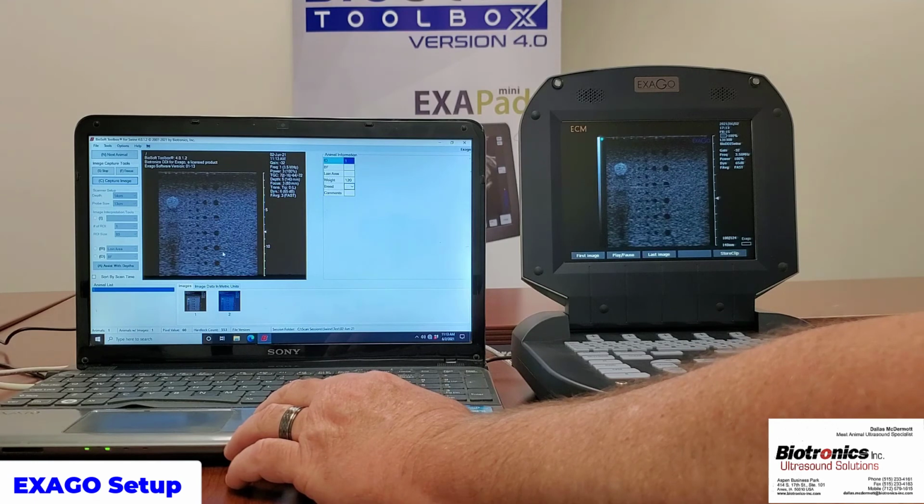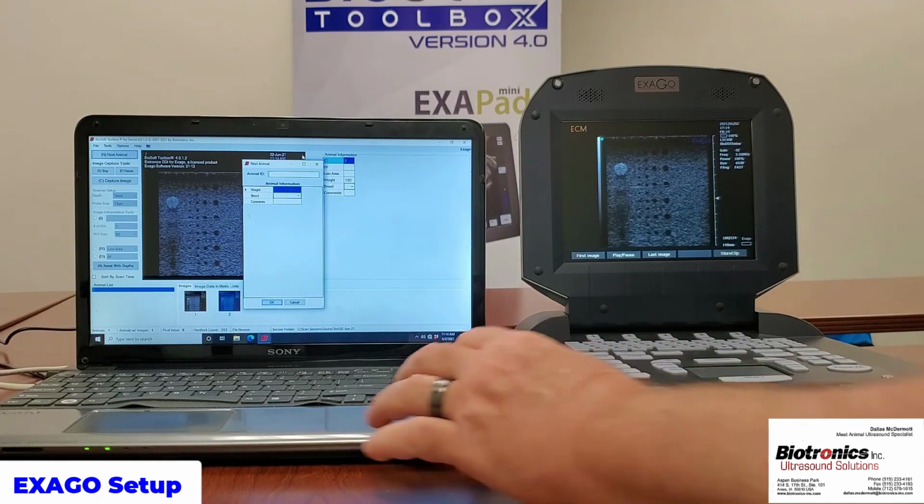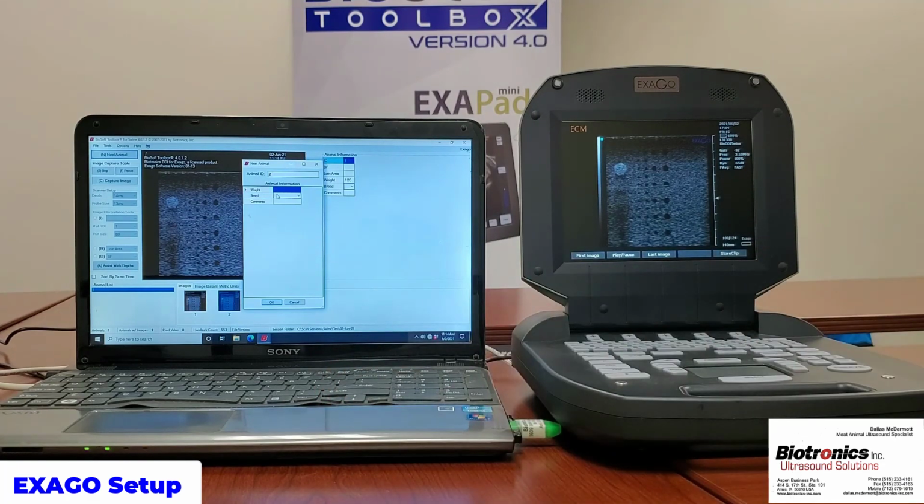If you want to go to the next animal, we can do this and then type in whatever number. We can also populate these fields by using RFID technology and using a wedge program, so that whenever you have the cursor in this field, it will automatically populate that field.